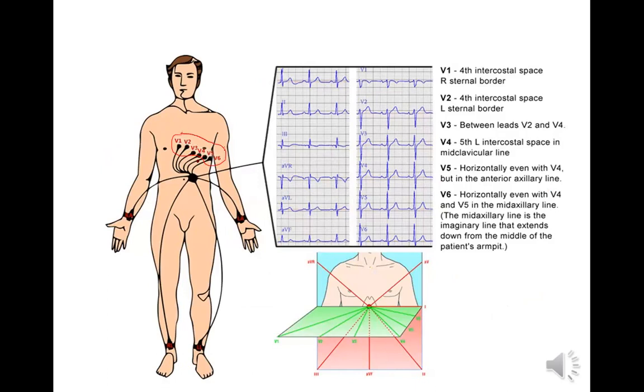So you don't have to memorize the colors of these electrodes. They do have colors that correspond. And if you really come and look at these machines and the electrode clips, they all tell you. It's going to say RA for right arm, LL for left leg, and so forth, so on with the V. So that's kind of helpful. So you really should take a look at that before you do it, because we're going to do it eventually.